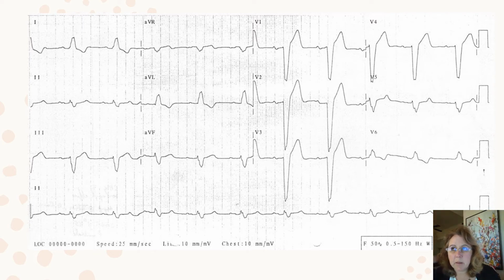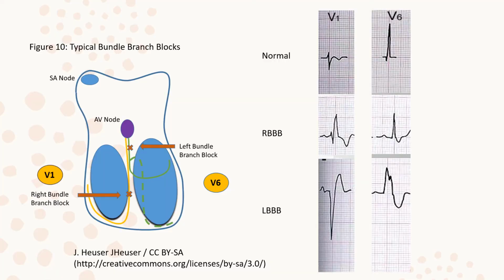and try to explain it in my head. Okay, why is this delayed? Because that's all it is. It's a delay. It's a blockage. It's a delay in the conduction of electricity down those bundles and having to find a reroute. We've been talking about them primarily being these big fascicles, the whole bundle branch being blocked. This was typical left, typical right bundle branch blocks.